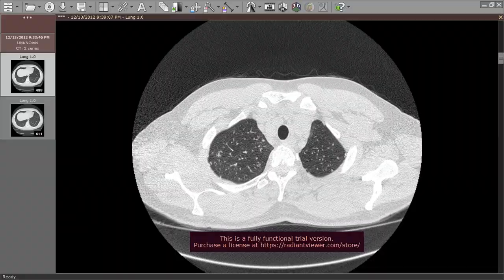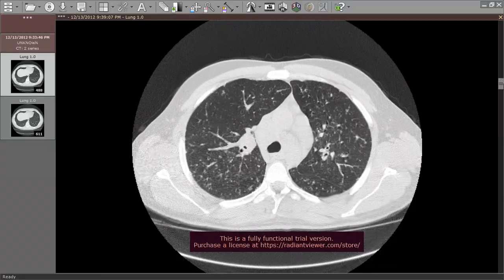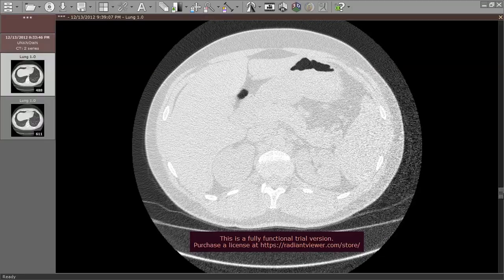So despite we have nothing but this, we can raise the possibility here of sarcoidosis versus less likely lymphoma, still for pathological evaluation. Thank you.